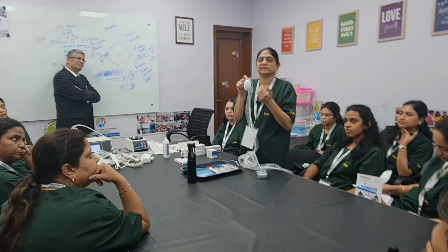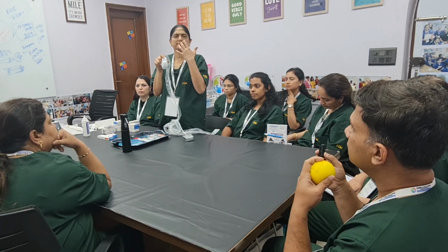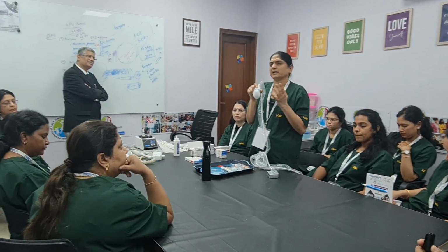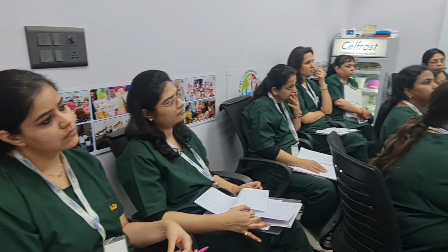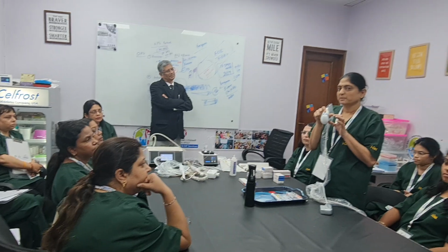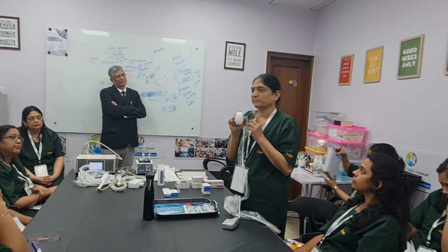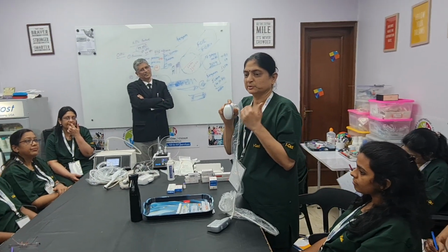It will not show the internal organs, but structural anomalies are beautifully seen on a 3D probe, especially cleft lip, cleft palate and those things. Rarely, if you have to differentiate whether a mass is arising from the uterus or ovary, it will be helpful, but it is not much use in gynecology. Abdominal 3D is more applicable for obstetrics than gynae.